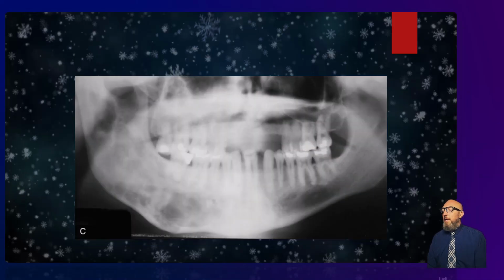Here's another one, a little bit hard to see in this panel, but you can really appreciate there's a difference from one side to the other. Is that just patient positioning, or is there actually expansion? Yeah, look at the size of this jaw. It looks almost multilocular, but a little irregular, a little like there's some internal ground glass appearance. But the expansion pattern is, again, classic for fibrous dysplasia.